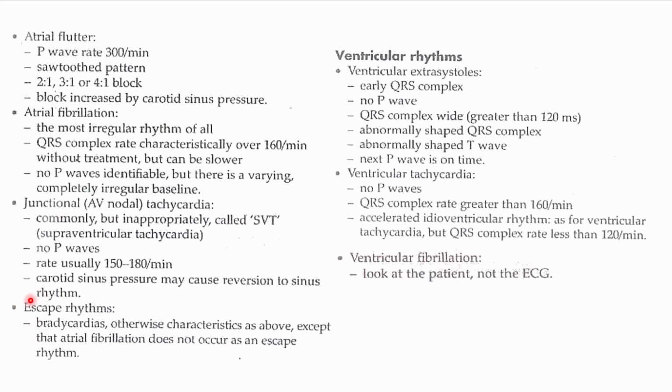Then you may get escape rhythms. So these are usually bradycardias, otherwise they are just like we have characterized above, except in atrial fibrillation, so you do not have an escape rhythm in atrial fibrillation.